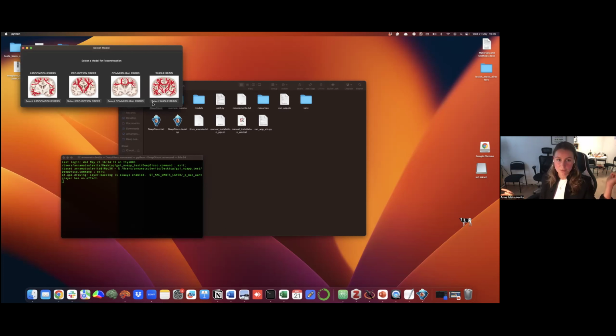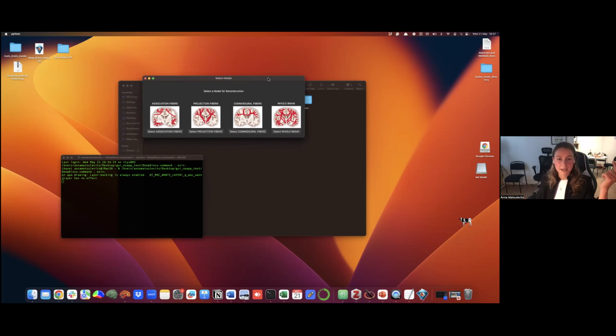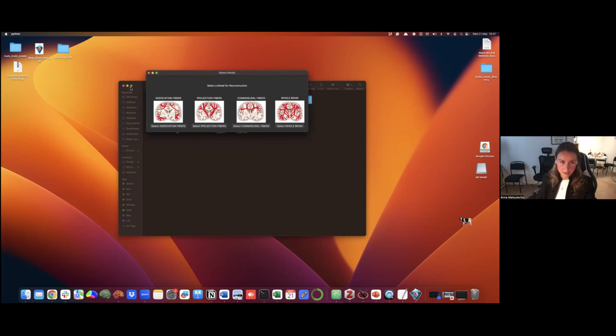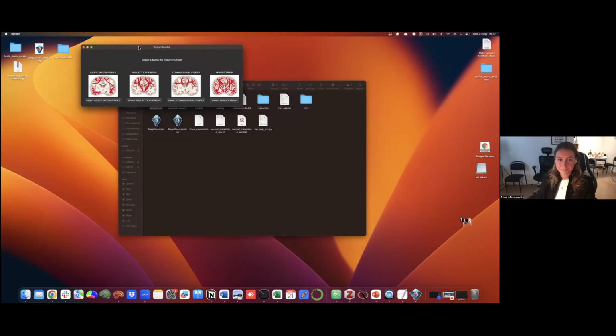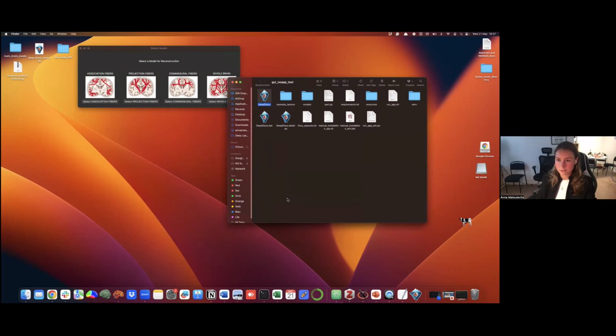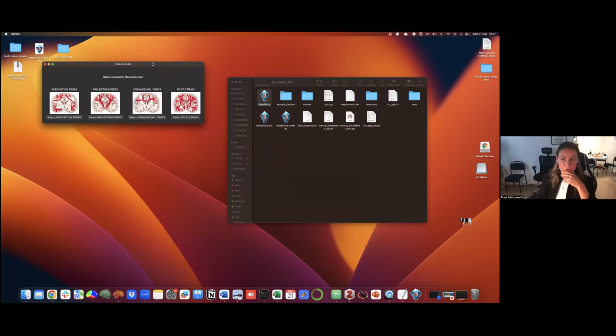Okay, here it opens. So we have this little cool icon of the Deep Disco, which I'm very proud of. You can't close the terminal since it runs in Python, so I will just hide the terminal. I won't hide the folder that you probably all have in front of you now as well, in case you were able to access the Dropbox.